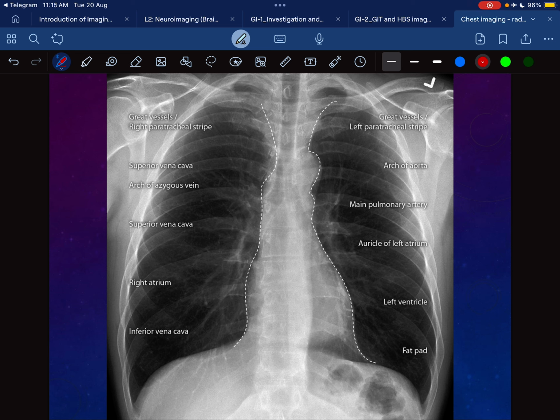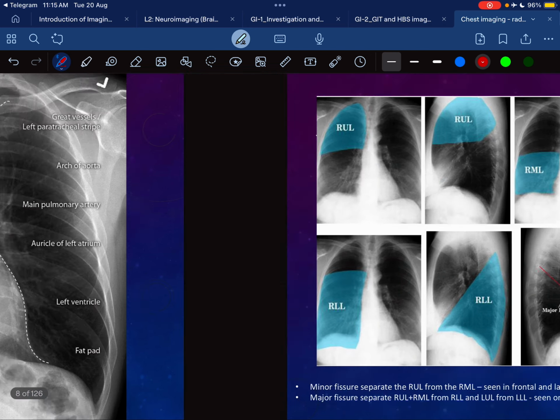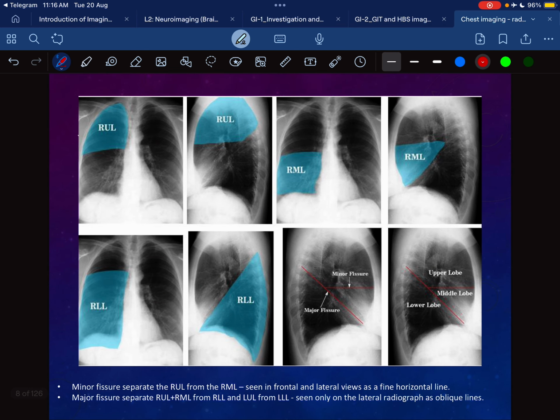Okay? The lung has 2 types of vascularity, arterial and venous, and it's normal to see these white lines. Crowding is not usual, it's sometimes not normal, so you have to be careful when you see it. In terms of the lung, why do we use the word zones?